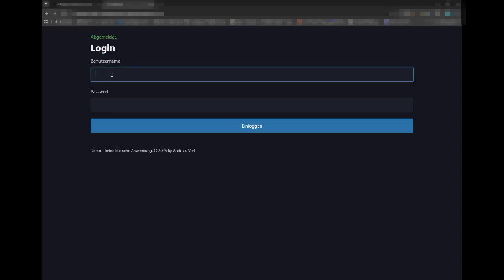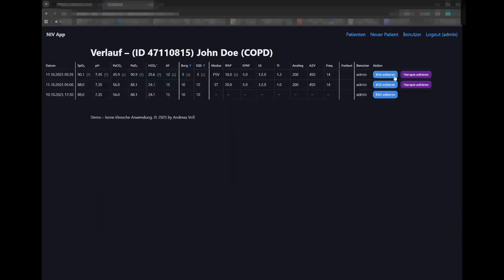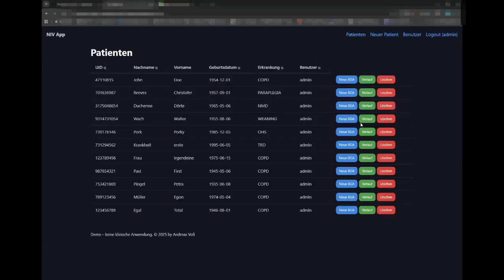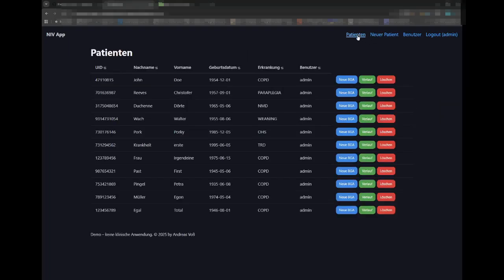The result is a secure, auditable, and streamlined path from structured inputs to guideline-oriented NIV suggestions with strong validation and clear workflows. Guidelines-informed decisions, clinically justified deviations remain possible. This software is purpose-built for medical professionals and may therefore contain details that not everyone will follow in full. Nevertheless, I hope this brief tour has made clear to non-specialists what the program does and how it works.